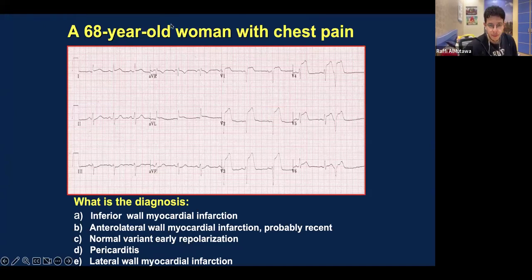Okay, practice time. People say it's LCA, but if the patient is still alive and they have that big of an infarct, I think that alone is a medical miracle. Okay, so you have a 68-year-old woman with chest pain, and then you have this ECG. So, what do you guys think?